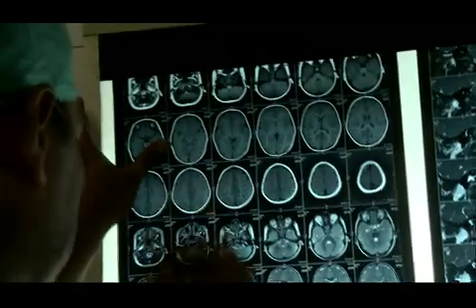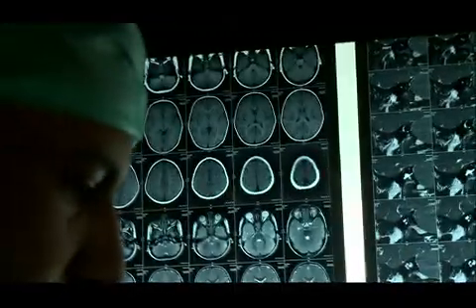Satish, please tell us about MRI also, how you know whether it is right side, left side. Okay, right side, left side is always mentioned. Deepak, on MRI, is the axial view better?